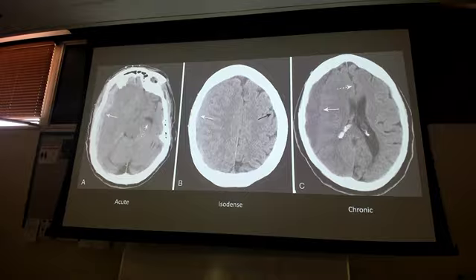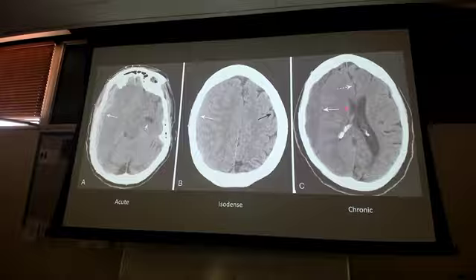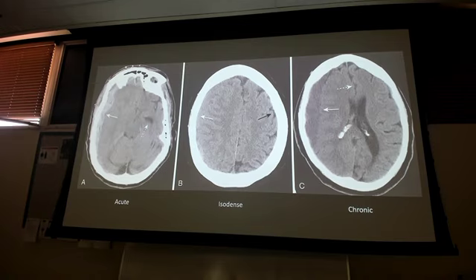What the white dotted arrows are showing you is what we call a midline shift. So we've got one ventricle here, one ventricle here. Here's the start of the midline, and I should be able to just draw a line straight down, and one should be on each side. One should be on each side, but it's not. I have a shift, and that's from the pressure of the bleeds. It can push and shift things over.